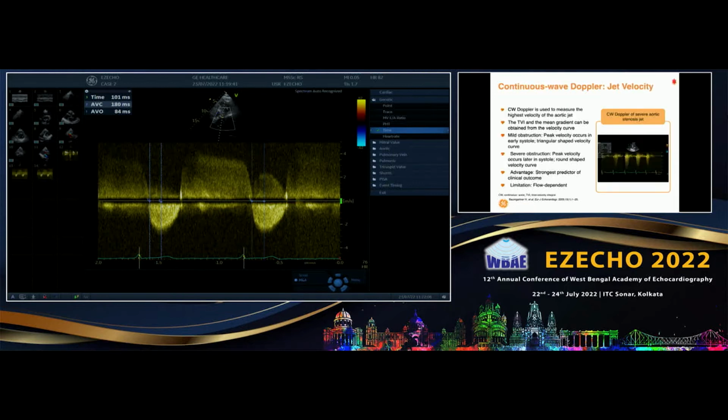Are you guys understanding what we are talking? Yeah, okay. Correct. So, Dr. Natesa Pandyan always says, everything in Doppler means something. And it is really, really true.